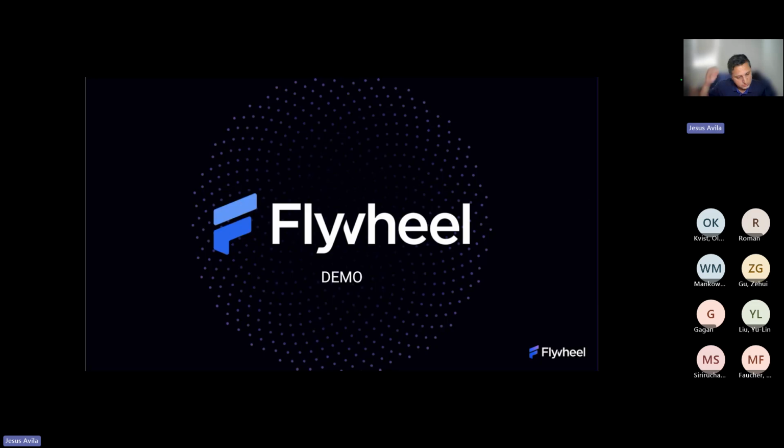All right, this is the point where we get to the demo. So if you'd like to follow along, you can do so. Again, you can access it at app.flywheel.io. Sign in, and you're going to see a screen.